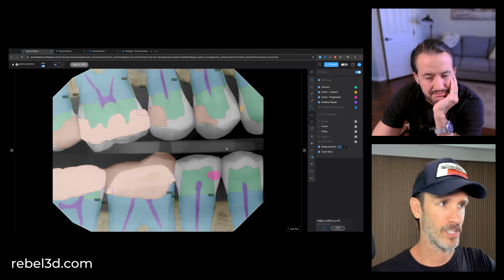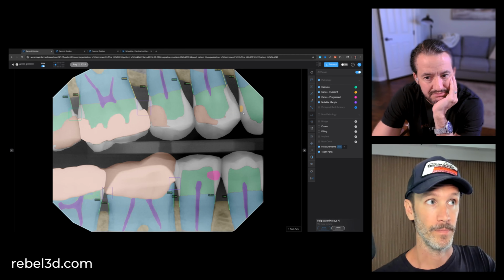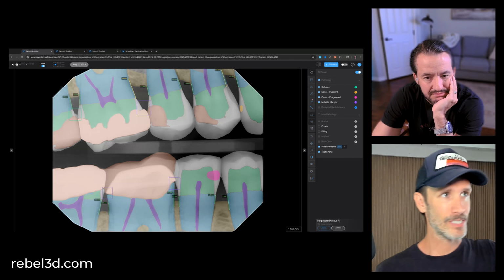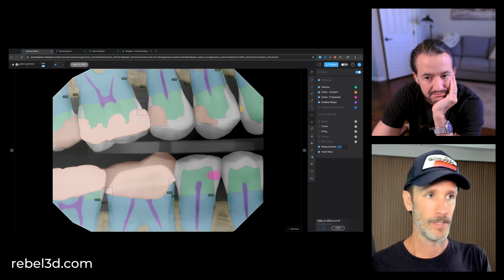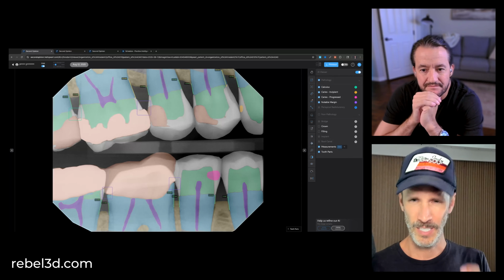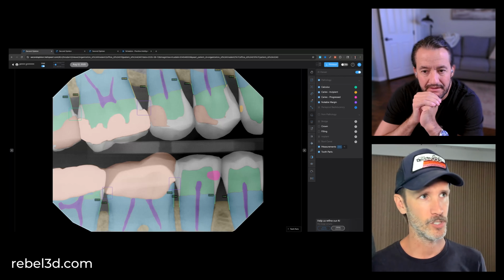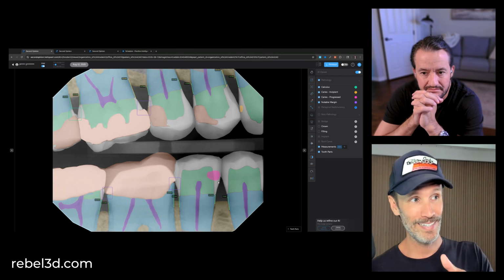You could have this conversation. Mrs. Jones, do you see this little yellow area right up here? Oh yeah. You see how it's still in the white region? It hasn't crossed over into the green. In our practice, we either watch those or we try to remineralize them with some starch particles. There's a company called Greenmark that I'm an advisor for, actually, that can remineralize these small little enamel lesions. But you see down here, there's a cavity that's gone through the white and into the green. When it passes that green threshold, that's something we need to take care of.